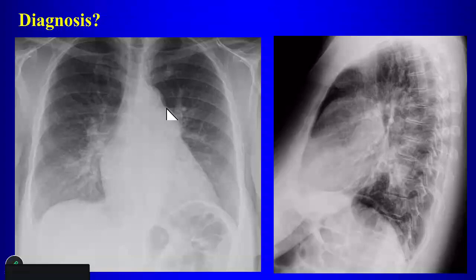Here, this patient also has a big central pulmonary artery, but you can't tell me what this patient's underlying disease is that's resulted in pulmonary hypertension. What's the underlying disease? There is pulmonary venous hypertension, right? So pulmonary venous hypertension, pulmonary artery hypertension. What chamber's enlarged? The left. The bulge is here, left atrium. So the left atrium is enlarged.